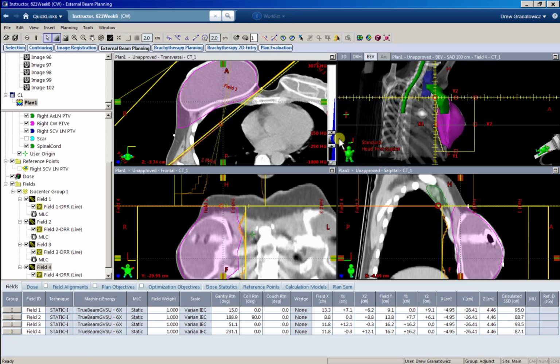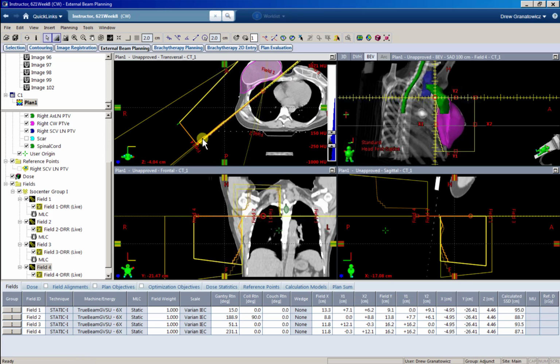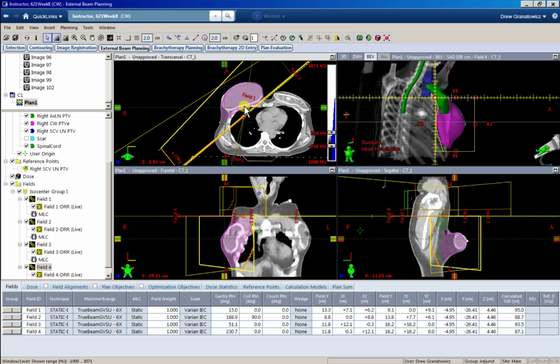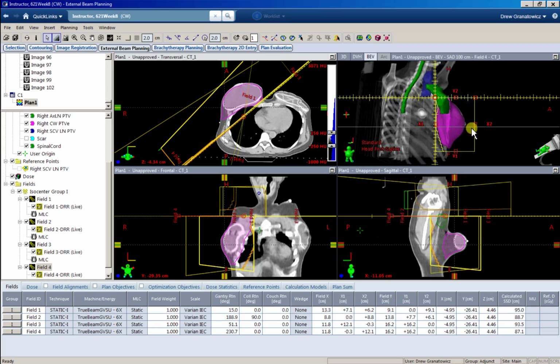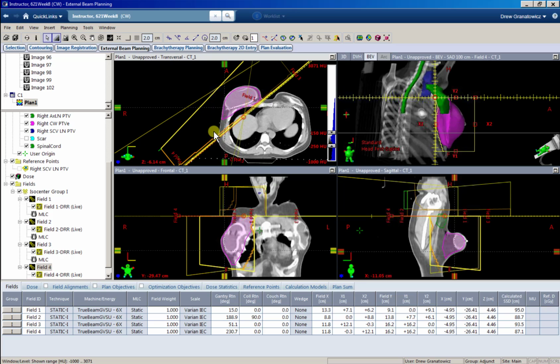I'm going to just go right to the middle, and you would normally want to rotate this side. Maybe I can rotate it a tiny little bit. But since our MLCs are very close to just our isocenter, we don't have to adjust that too much. You always want to make sure your flash is okay. You might need to add more flash from that lateral side, or maybe on the bottom border, but it really looks pretty good as is.